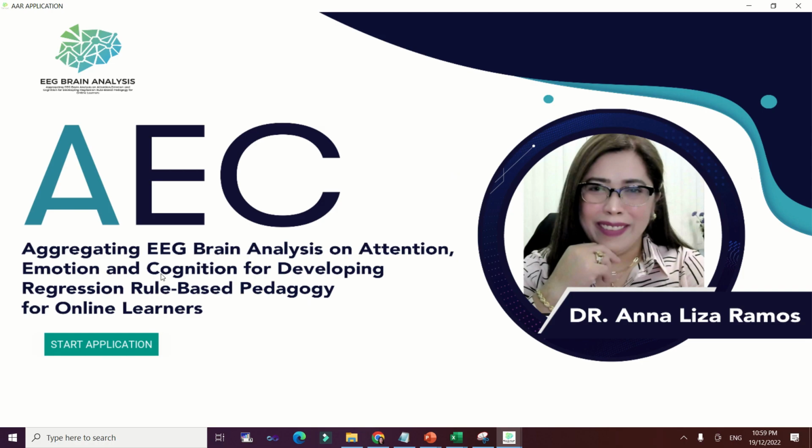This program was created to provide a tool for educational strategies to examine the mental load of students, which includes attention, emotion, and cognition, in order to recommend a pedagogy for a specific learner.